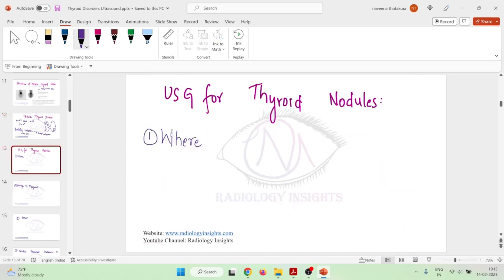Then, USG for thyroid nodules is very important. On ultrasonography of thyroid nodules, one thing you have to see is the location of the thyroid nodule: whether it is present inside the thyroid, that means intrathyroidal, or extrathyroidal, that is outside the thyroid gland.